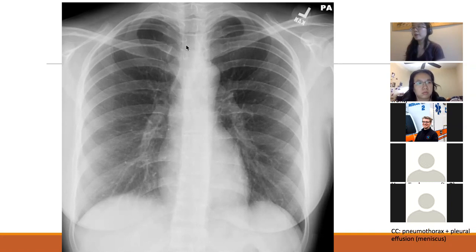Okay, so now we've broken down the structure of the lungs a little bit. We've gotten the left and right primary bronchus. They're going to branch into the secondary and tertiary bronchi and bronchioles, and then get smaller and smaller until they eventually become the respiratory bronchioles and alveoli. The point where all the vessels from the heart enter the lungs is called the hilum, right? And that's going to be around here.